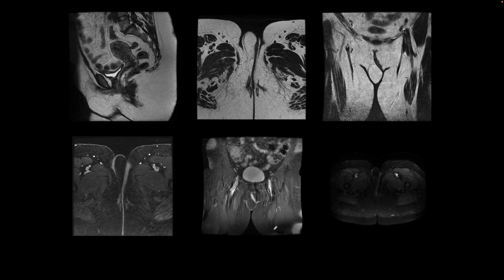This is our next patient. They presented with a labial swelling, and the swelling was evaluated using an MR of the pelvis. So this is the swelling. It has same signal intensity as the subcutaneous surrounding fat. It is seen right here in the right labia and also right there.